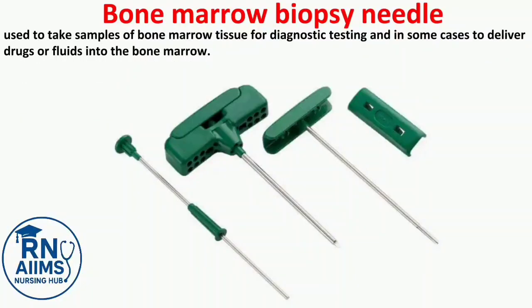Bone marrow biopsy needle. Used to take samples of bone marrow tissue for diagnostic testing and in some cases to deliver drugs or fluids into the bone marrow.